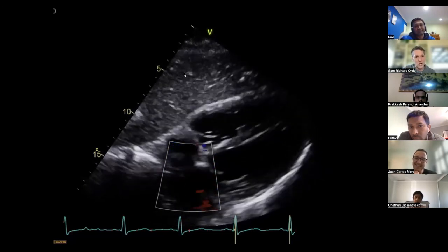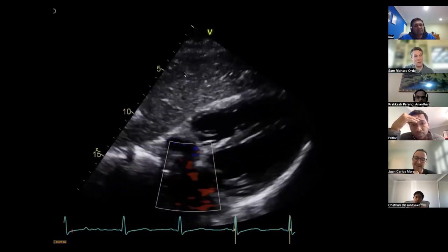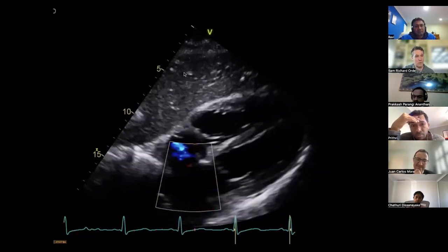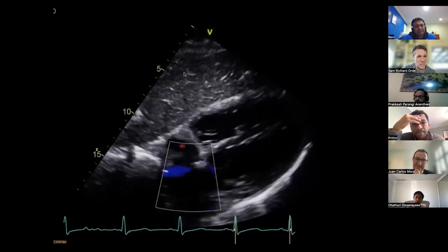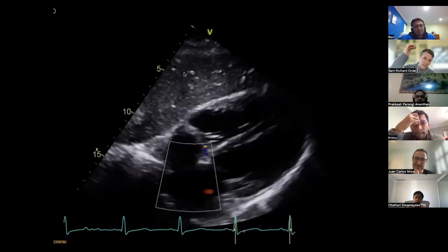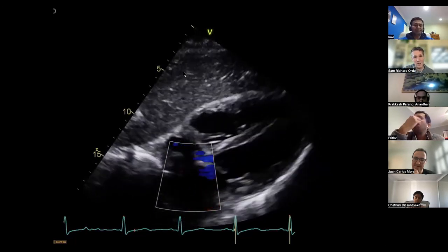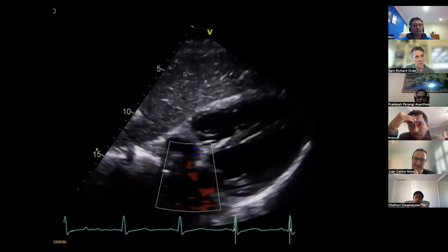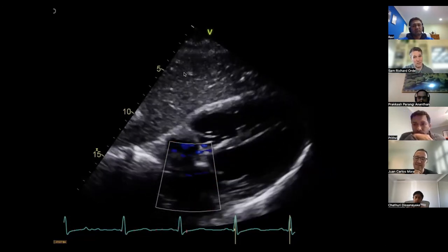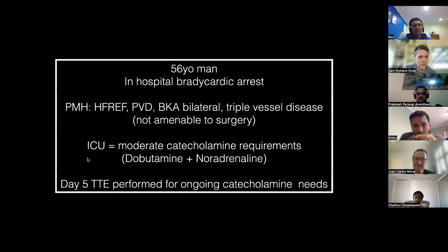But in conclusion, I'd have suggested that this guy needs to have a transesophageal echo at some stage to exclude a shunt. And if that is negative, then we need to work him up for pulmonary hypertension, which doesn't look severe based on the tricuspid regurgitation. But the etiology, as you said, ASDs at the top, and then thinking about weird pulmonary hypertension. But why we're not seeing any horrible TR has got to be investigated, and maybe that's just an imaging thing. Not bad.